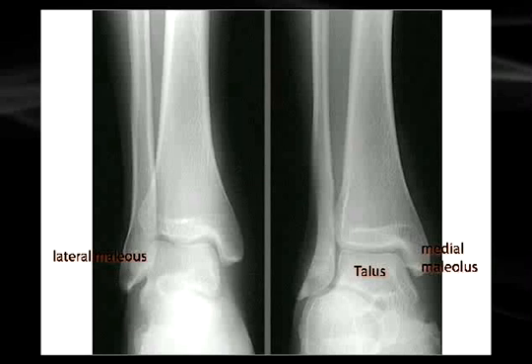We'll just move past this particular image. Take a moment and see what you can find here. It's kind of for self-review. This will help you to get familiar with which bones you can see in which images, and you can also take note of the malleoli and the fibula.